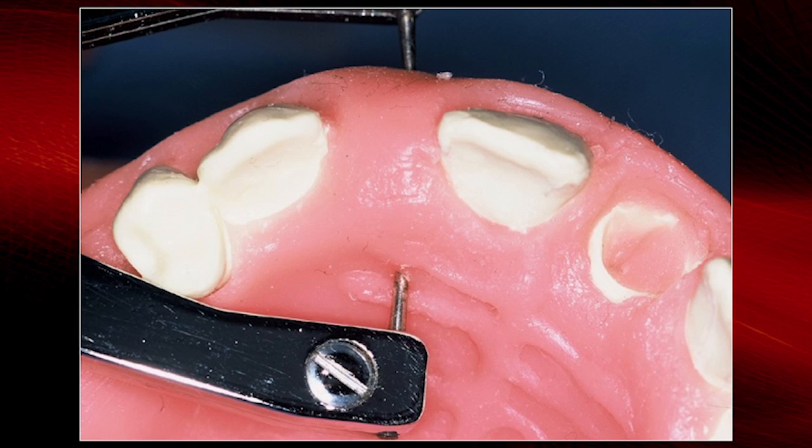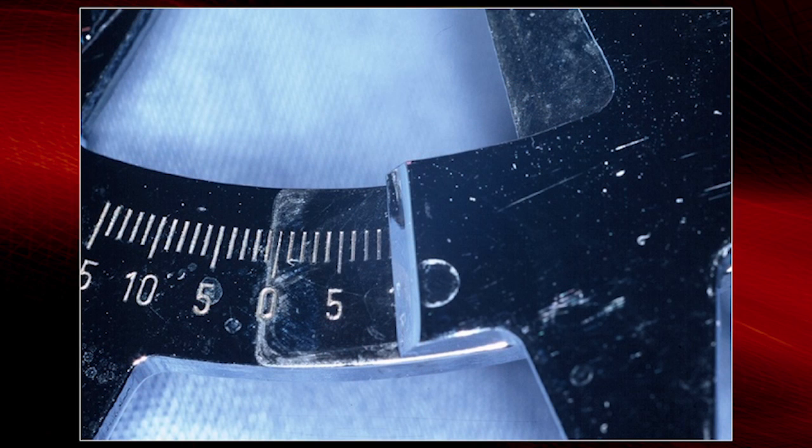So you can take a bone caliper, anesthetize the patient, and then this bone caliper has a needle on the buccal, a needle on the lingual, and you put them together, and it tells you how wide that bone is. Ideally, for a 3.5 millimeter diameter implant, we would like to have 5.5 to 6 millimeters of buccal lingual bone.